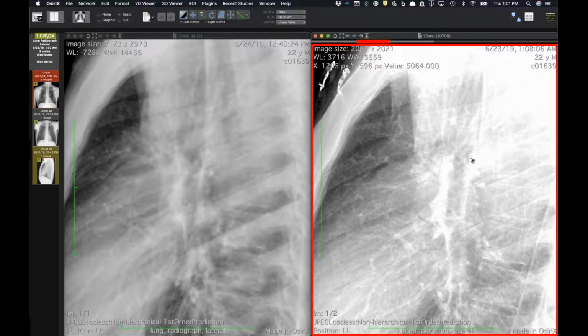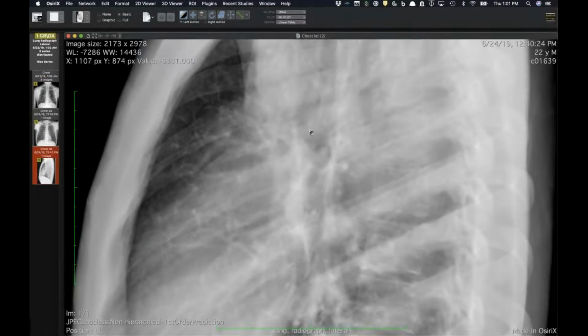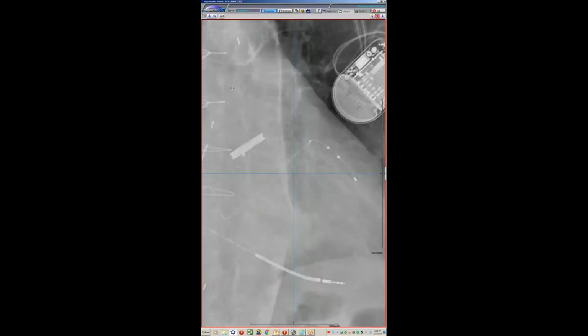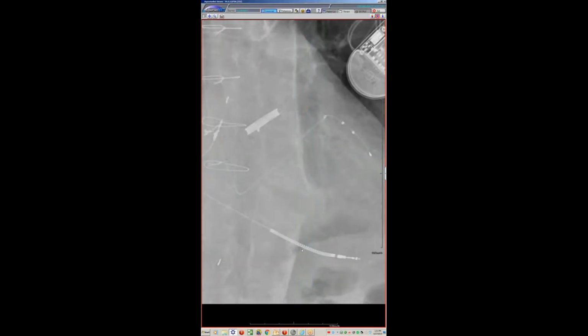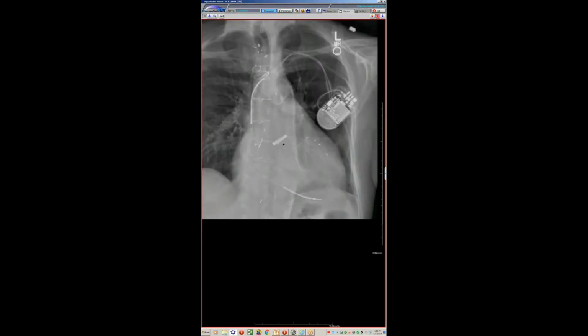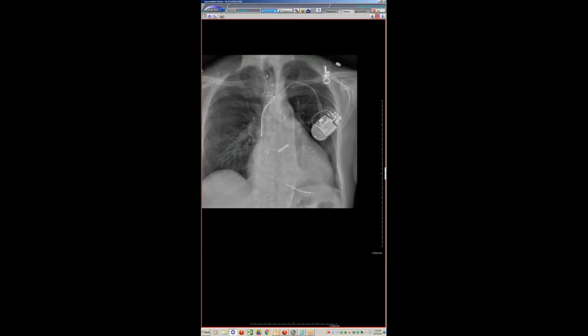Real quick, can you show my screen for half a second? Sorry, let's see here. Just for the sake of completeness, here's what I was talking about with that other aorta. So you can see this, the most calcified aorta I think I've ever seen. And then the calcium just stops, and there's this little bit, which was much bigger, and that was the finding. But I'll send that along.